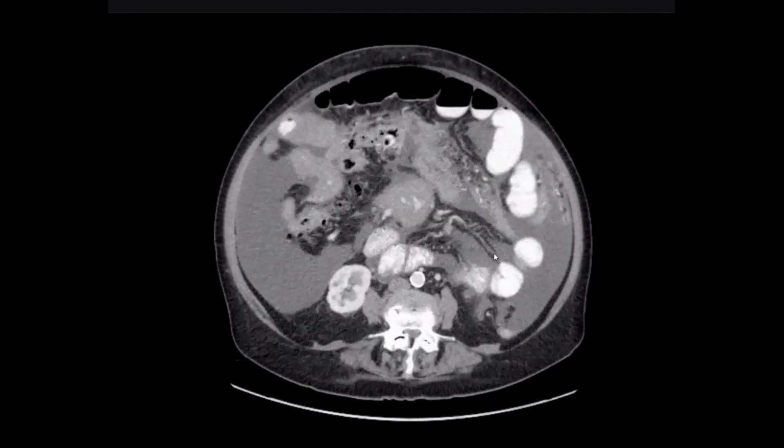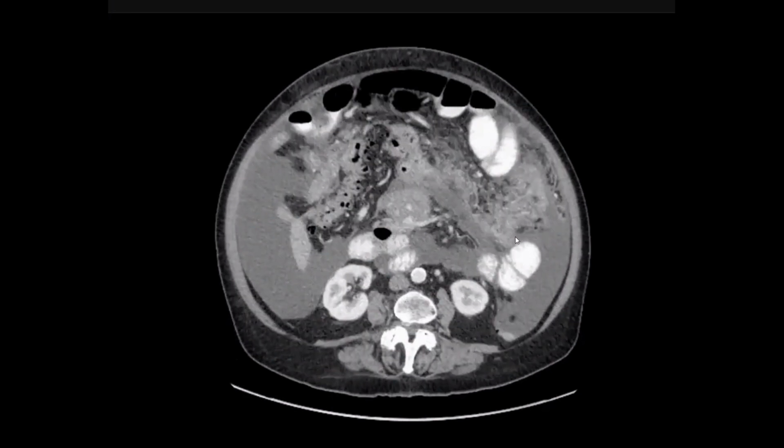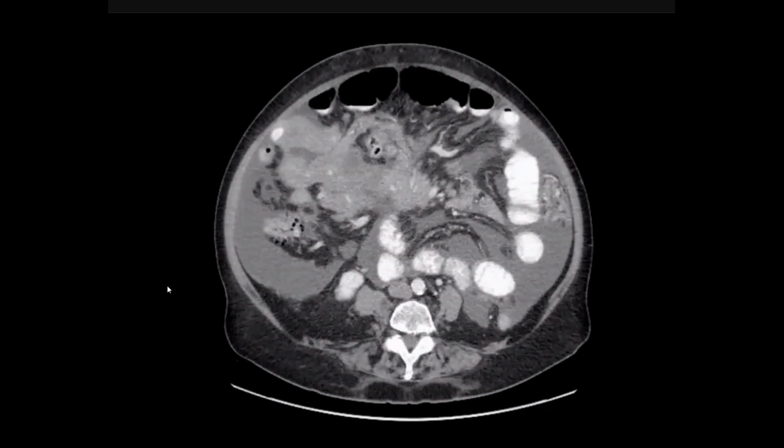Agree? So, sir, can it be lymphoma? Because there is long segment thickening and diffuse thickening of small bowel. Yes, lymphoma. And we have also soft tissue lesions encasing the mesenteric vessels, looks like lymph node enlargement. So we have a case of peritoneal lymphoma. Yes, sir, peritoneal lymphoma.